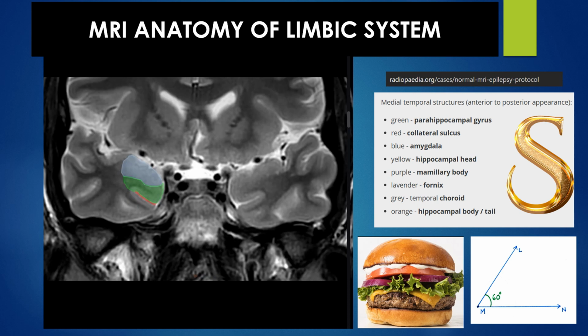Now we'll stop at this and see what is going on here. As you go more posteriorly, see the gray and white matter. See this gray matter, this white matter, how thin these things are. So when it is in the temporal lobe, it is very thin. This is the last part in which we are able to see a clear white matter. Then after that, you are able to see a chunk of gray matter, which is seen here.